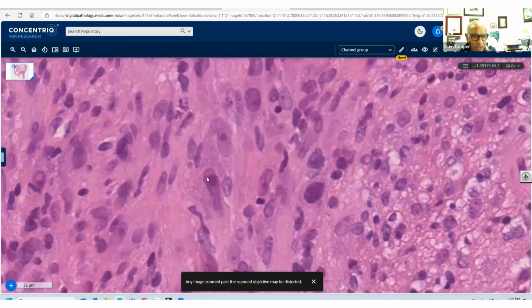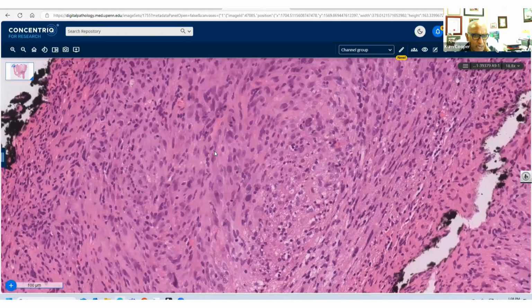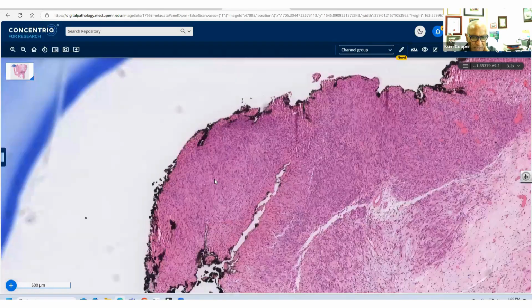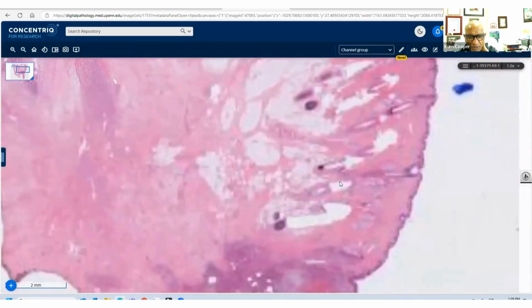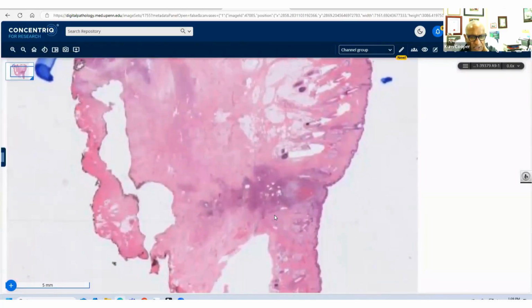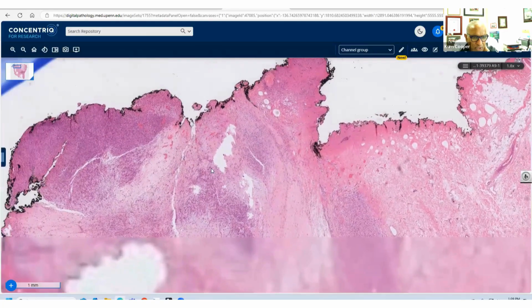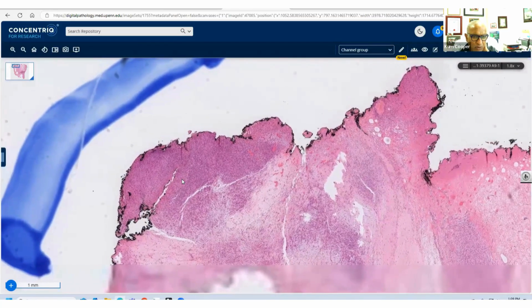There are these large prominent nucleoli. That's pretty large, and Maria very nicely spotted those and brought in melanoma, which you have to. This is quite deep. He is young, but melanoma has to come into that differential. You can see the previous excision. I'm just waiting for this to focus. The previous excision, just if you came in late, and this is a residual tumor, which is at the deep edge of the margin, right in this top left-hand corner of the slide.